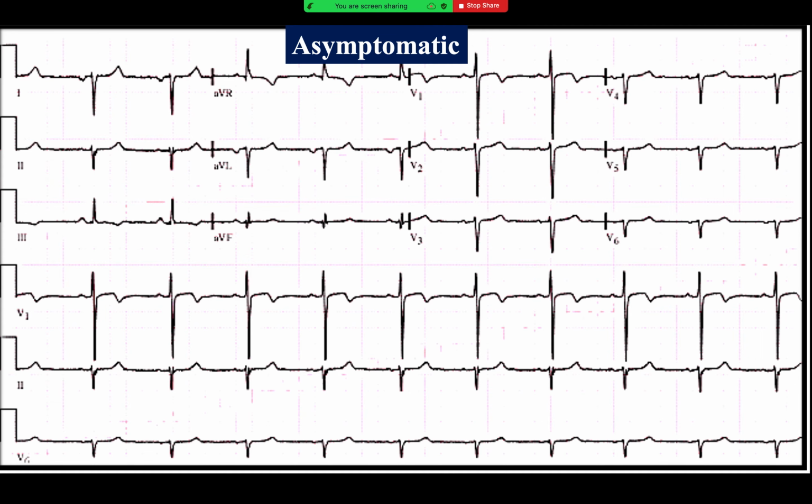So what do we notice? In this we can see the patient is in sinus rhythm. The axis is right axis deviation. However, in lead 1 and AVL, if you notice there is a negative QRS. And in AVR, it is positive. So a lot of times someone may think that there may be lead reversal, but there is no lead reversal. In fact, if we look at the left precordial leads, there is progressive reduction of the R/S amplitude.